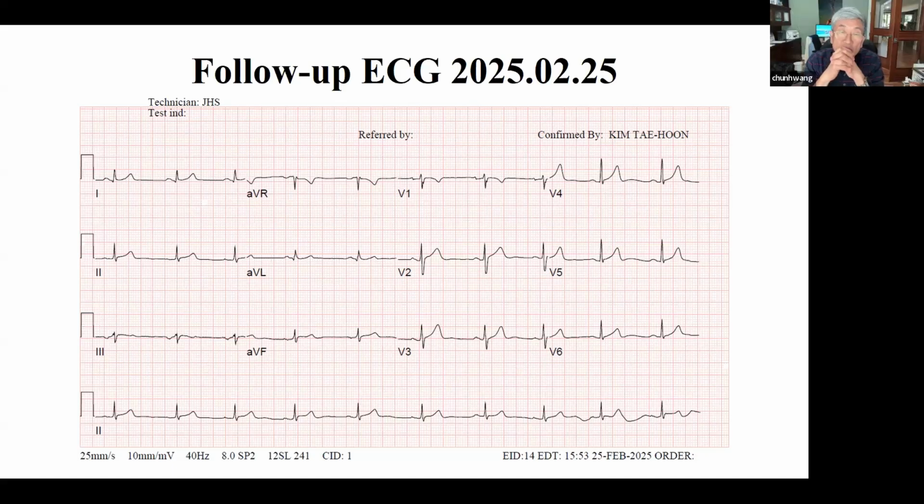Okay. So could it be this patient may have some conduction abnormality? And you also notice in V3, the P wave duration, second component notched. That's a left atrial P wave, very small. Okay. So those are typically what we see in this type of patient. But the P wave axis also, this patient is not completely normal, right? Because lead 3 is still negative. The sinus node location is perhaps a little lower than you would like to see.